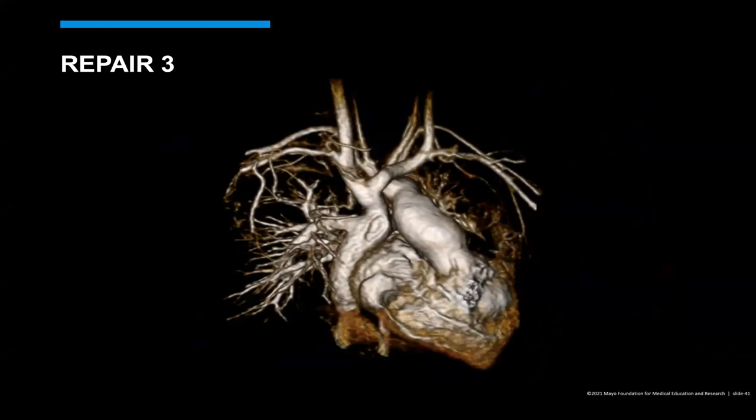Okay. So it looks like, I think this was a hypoplastic left heart repair. I think that there's a common outflow tract, which was originally the Norwood procedure, coming out of probably a combined large ventricle. And then there's a Fontan procedure as well, which is completely bypassing the right atrium, I believe, and going into the pulmonary vasculature. And then there should be an ASD as well, which I don't think we can see.